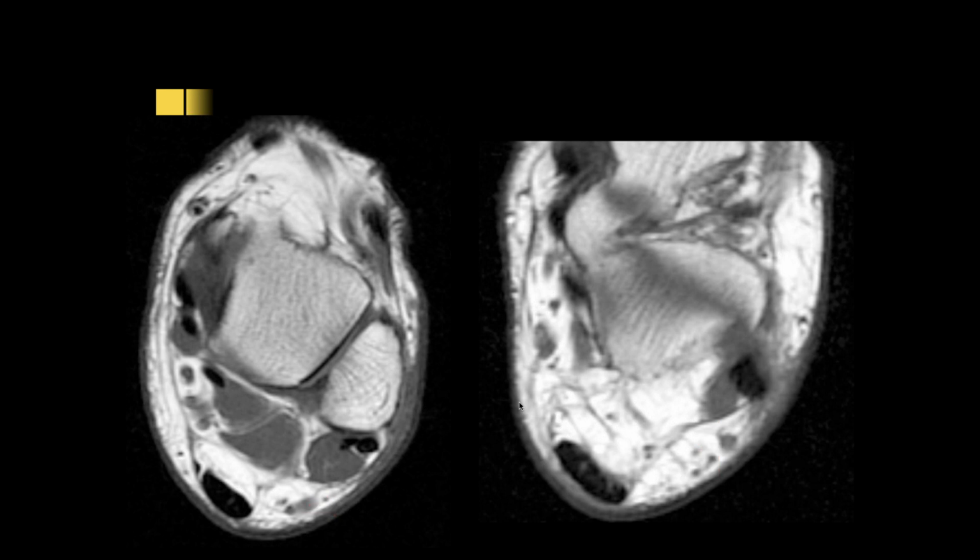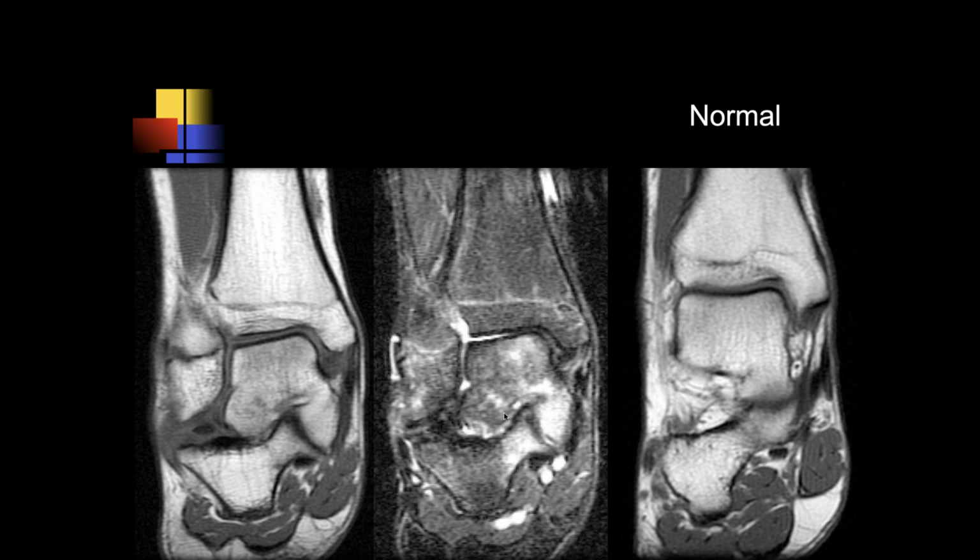What's in between, John? What's in between the 2 bones? Here? Yeah. This is a diarthrodial joint, so it does have articular cartilage there, at least early on, until it becomes degenerated. I always thought it was fibrous. If it's fibrous, then it would be a coalition, right?